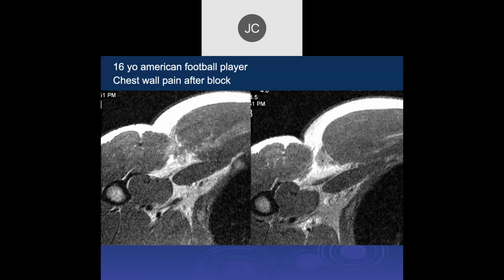Yeah, I guess it's not. Here's the pectoralis major muscle. Oh, I'm looking at the other adjacent muscle. This is the deltoid. This is the humerus. What's this? Yeah, that's the tendon of the pec major, so the tendon is still attached to the bone, right? Yeah, but is that another different muscle adjacent to it? And then that's the tear and the retraction.